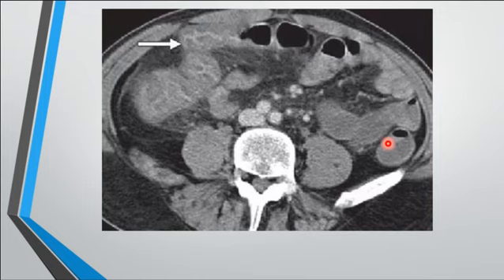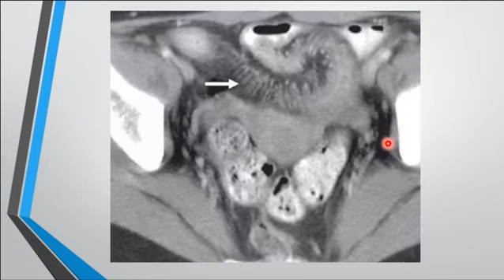Okay, now what about here? What's the sign? I can't hear. Can you help? Coin sign. What? Coin? Okay, what else? Comb sign, exactly. Comb sign. What's the comb sign?